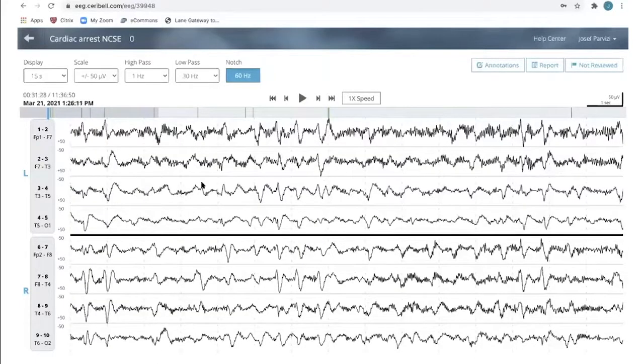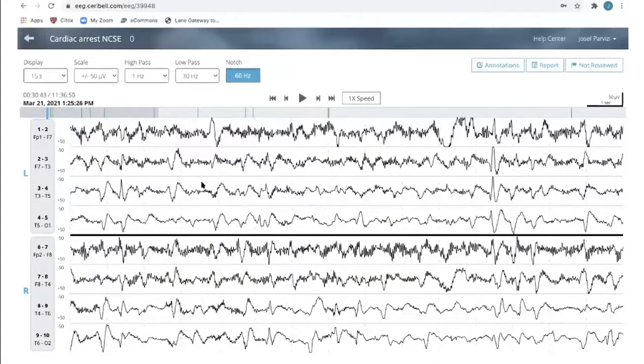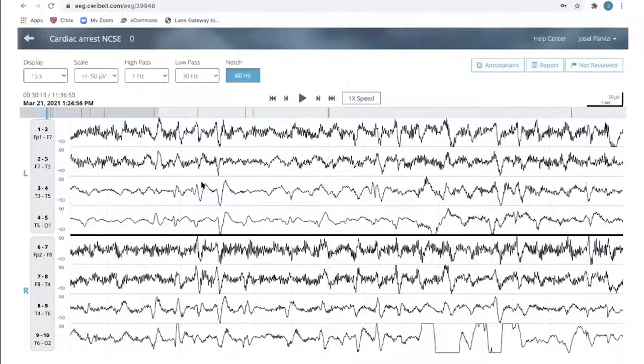One consideration in a patient like this, not necessarily this patient, is how much of this is reversible, how much of this is not. He had an arrest, but he also has reasons for encephalopathy that's metabolic. When I see discharges that vary like this and become very clean and very close together and then go away, I tend to orient myself toward being epileptic and reversible because of that fluctuation.